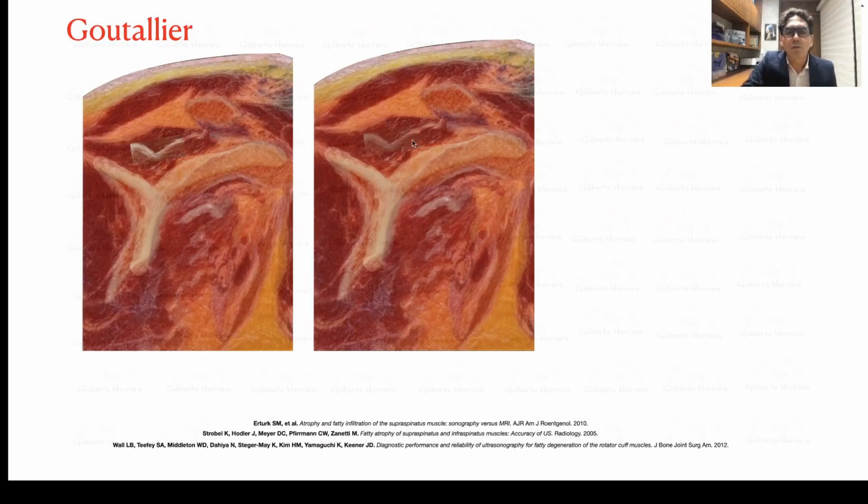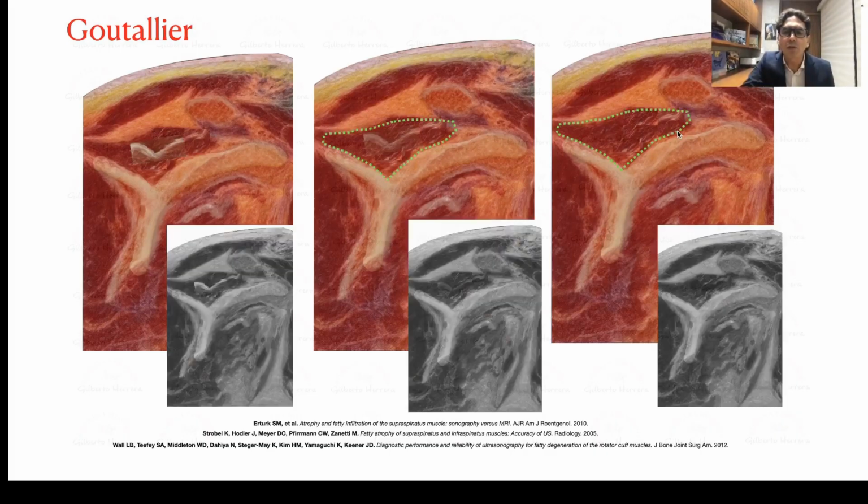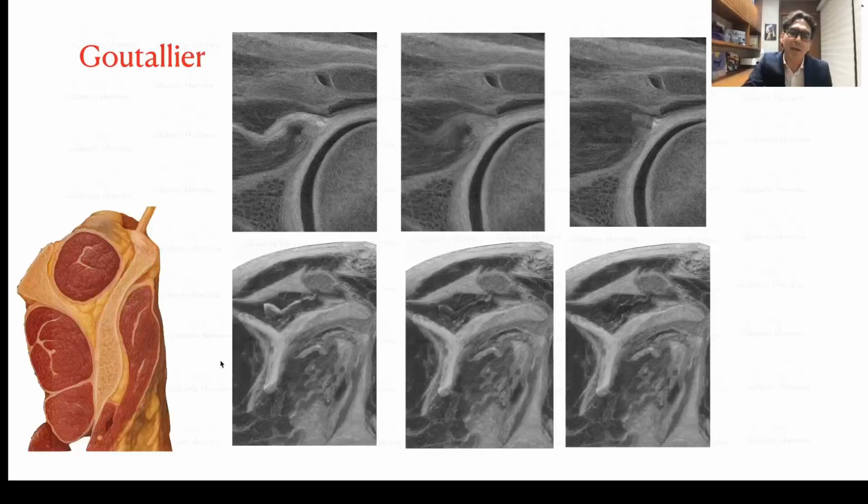Our short axis view, tendon fully visible, partial loss. We've already seen this in the long axis, now in the short axis. Look, here, there's no tendon anymore. This is what we wanted to show with this drawing, and here we would also focus on this, which would be the tendon. Here it fades a bit, and here we've schematized a loss of it for this image. So in grayscale, what we're basically trying to see is this, the presence or absence of the central tendon with normal muscle characteristics. Here, both the tendon and the normal characteristics are lost in both planes.